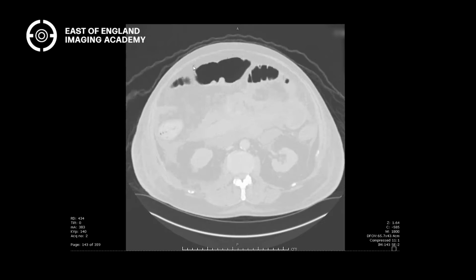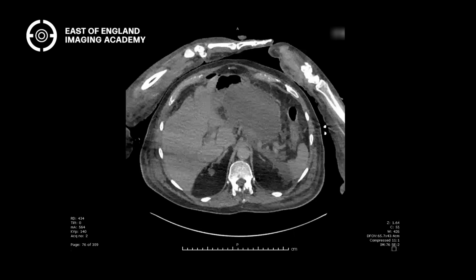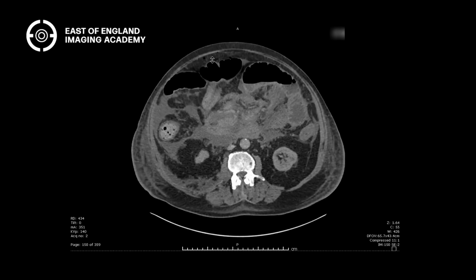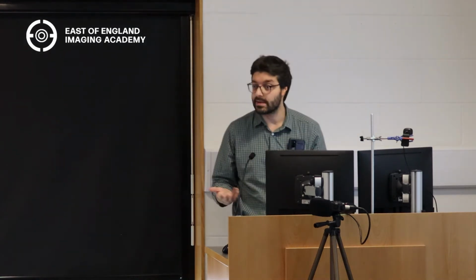And look, on the lung window, you can see free gas really nicely. Look at these tiny little bubbles of free gas, sitting obviously anteriorly because gas rises. So you can see lots of free gas and even more free gas up here, right? Which is much more difficult to appreciate on the normal abdominal window because it's not highlighting the air, whereas on the lung window, suddenly it's really blindingly obvious. So this patient has developed necrosis of their sigmoid colon. So ischemia, infarction, necrosis, perforation of the sigmoid colon as a complication of their pancreatitis. Does that make sense? Yeah.